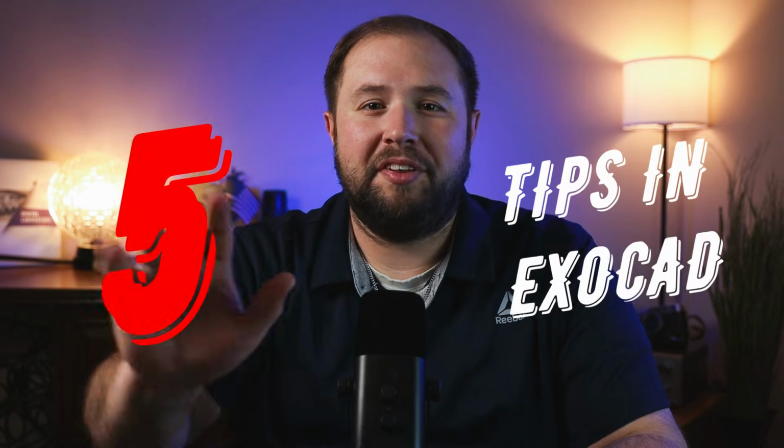I'm going to go over 5 tips in Exocad. Hopefully these tips will help you, make you a better designer, and solve issues that you may run into.